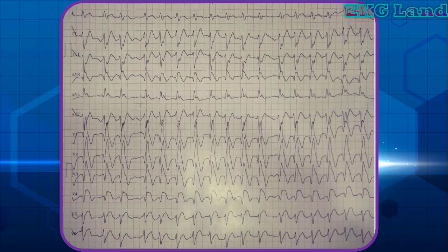There are 3 main steps to interpret every heart rhythm. 1. Locate and examine P-wave morphology. Here, the P-waves are not obvious enough, due to the underlying tachycardia and broad-based complexes. But note that, in such an electrocardiogram, gaps between R waves often help us discover hidden P waves.